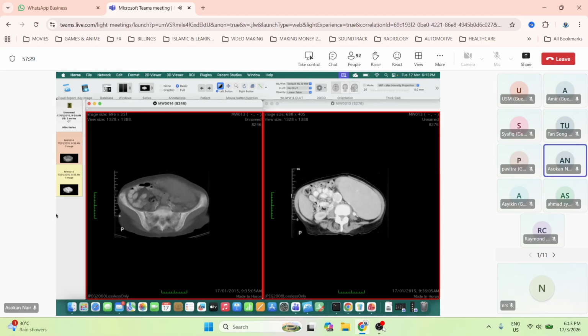You say the bone is lytic. Don't you think the density is high? There are patchy sclerotic areas. Yes, there are patchy sclerosis, and I think there are areas of hypodensity as well. Okay, fine. So now with that finding and this big mass, like you say, what's the possibility? It can be originating from the... I think the bones are as a result of metastasis.